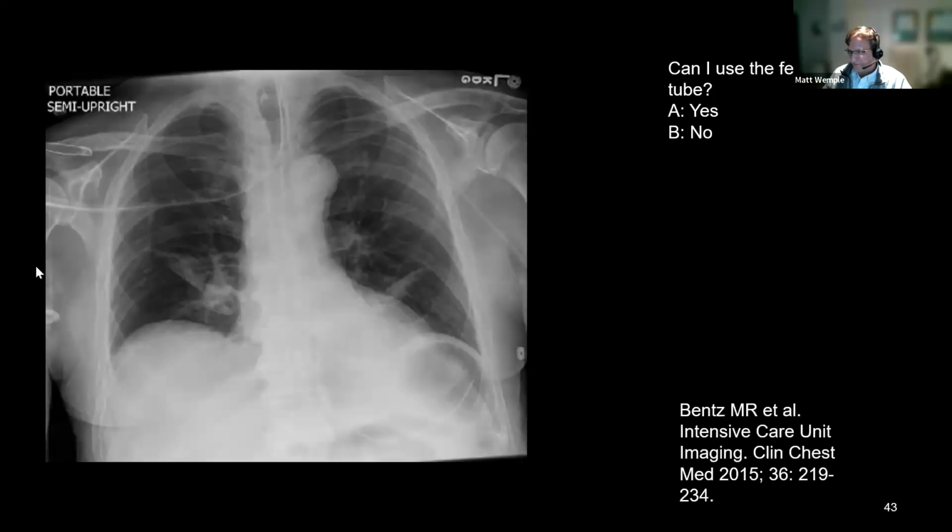All right, what about this one? Okay. Yes, great.